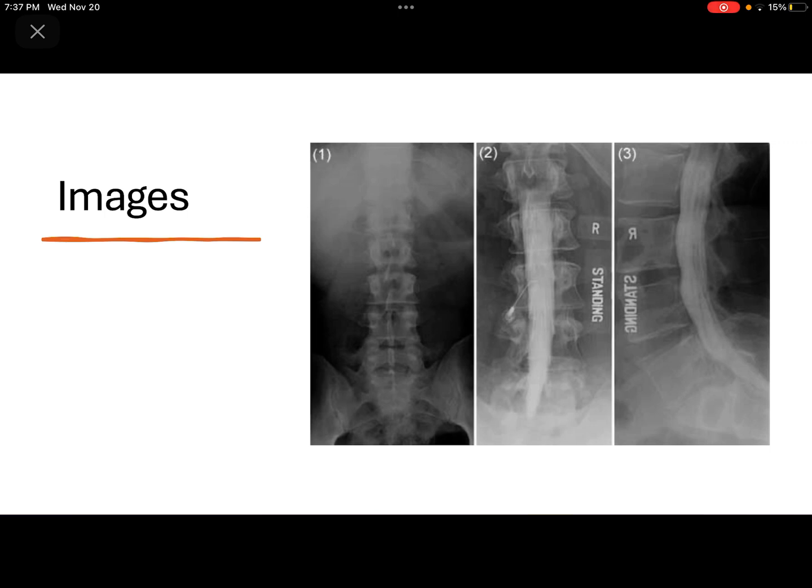Images 1, 2, and 3 are all done under fluoro. 1 is a scout image. 2, you can see is slightly rotated due to the Scotty dogs being shown, and 3 is a true lateral. The only thing I would correct is image 3 has the marker in the anatomy. Everything else looks pretty good. In image 2, you can also see the spinal needle.